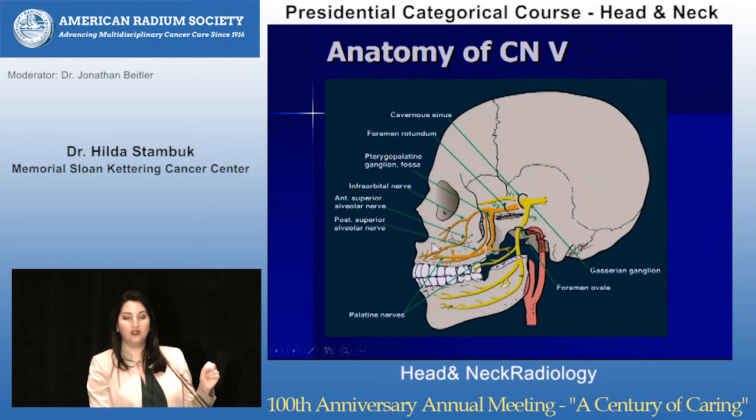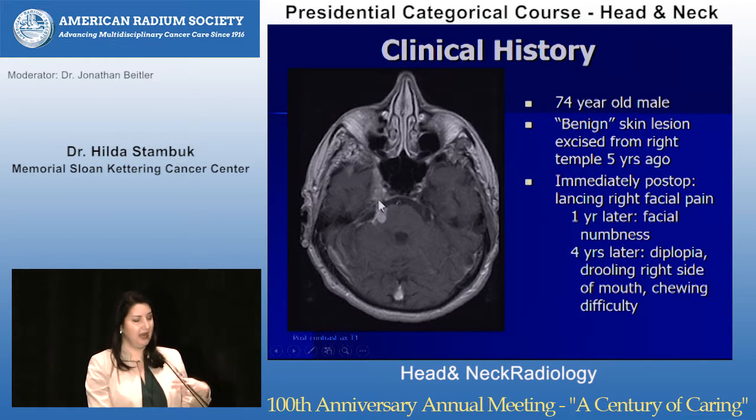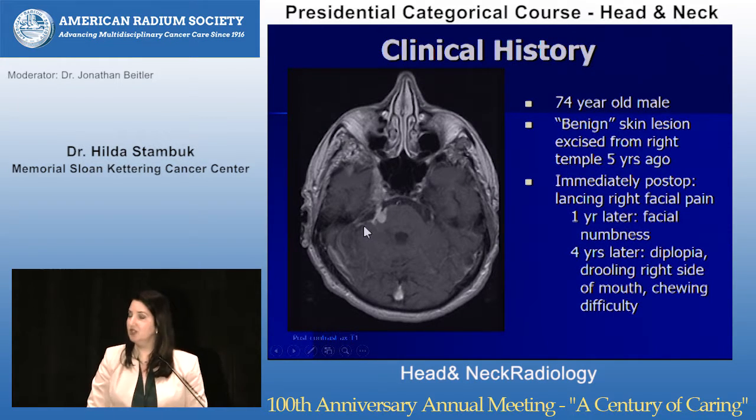If you have a tumor on this cheek, you can see how it goes along the infraorbital nerve and makes its way back to the brainstem. If it's on the hard palate, here's that pterygopalatine fossa again, which is rich in nerves and can give you tumor spread from orbit to hard palate to infratemporal fossa to nasal cavity to brainstem. If you have a chin lesion, it can go along the inferior alveolar nerve, or an oral cavity tumor can go on the lingual nerve.